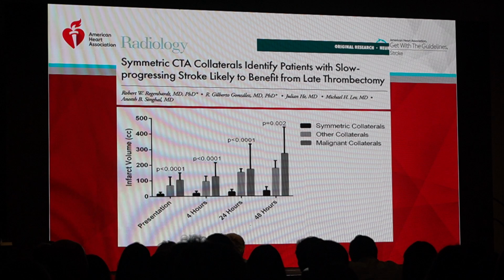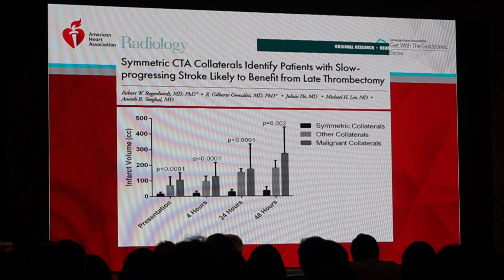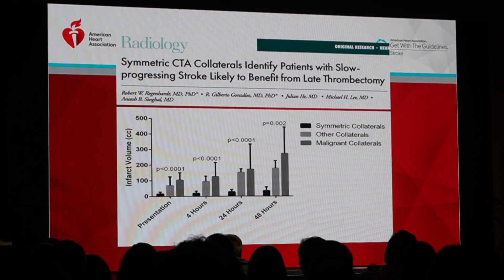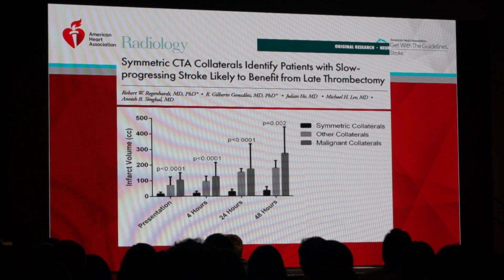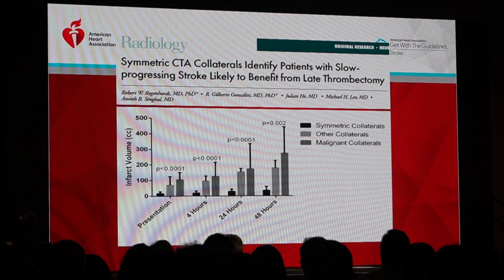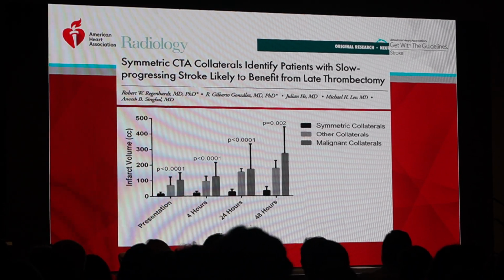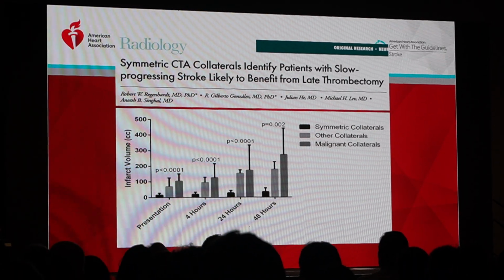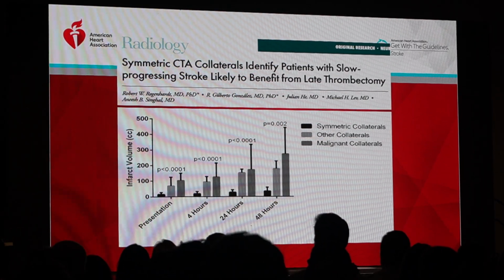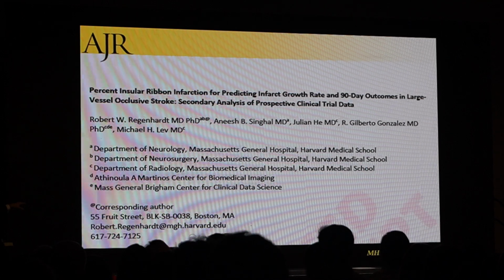And be careful, because you might think, well, if I see a lot more vessels on one side, then the opposite side is probably the ischemic side. But don't forget, before the collaterals collapse, they actually have delayed venous outflow. And it could look like there's more collaterals on the ischemic side because there's very sluggish flow there. So that's not going to help you. If you look at the thing and can't tell which is the ischemic side without looking at the vessel occlusion, just call it symmetric.